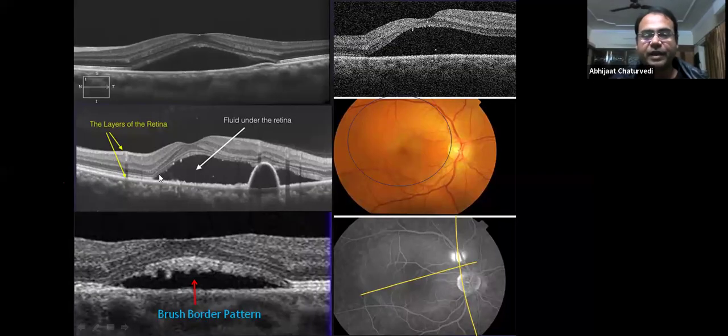So in this image, you can see that this is the part below the retina. However, the RPE is below this. And there's an acute angle over here, roughly around 45 degrees or something like that. However, in a pigment epithelial detachment, you can see the fluid is below this RPE. And this is the sign of differentiating a PED from an NSD, a pigment epithelial detachment from a neurosensory detachment. Note the angle here is somewhat perpendicular. In the first it was acute. In this, it is perpendicular.